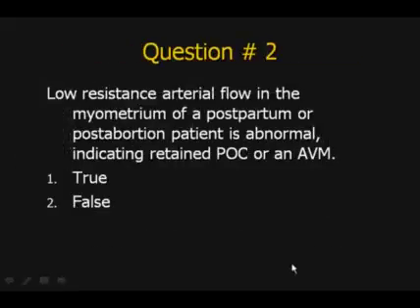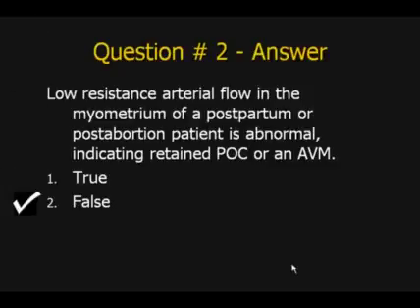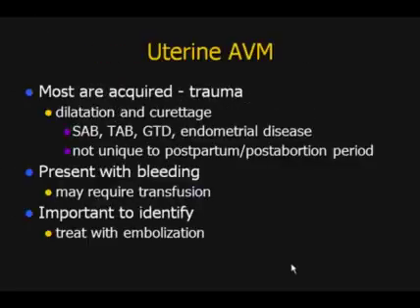So another question: low resistance arterial flow in the myometrium of a postpartum or post-abortion patient is abnormal, indicating retained products of conception or an AVM. True or false? Well, false. What we know is that you can occasionally see this as a normal finding.